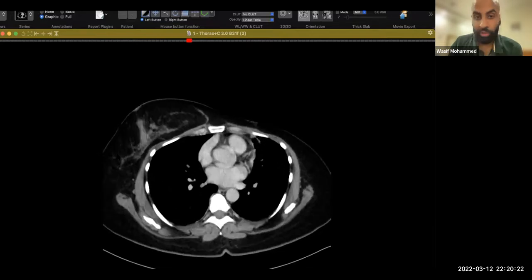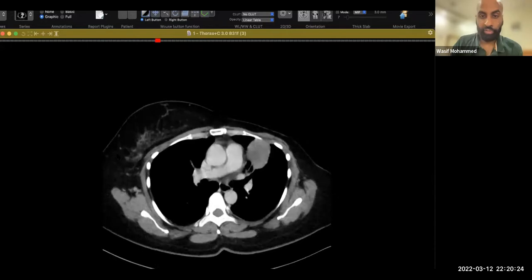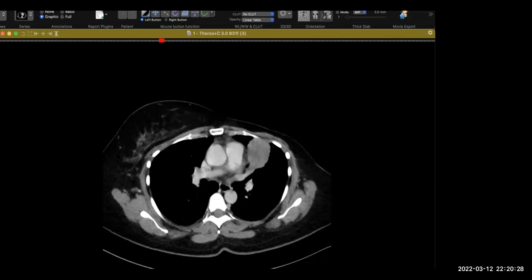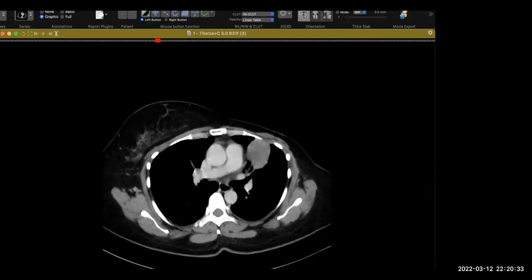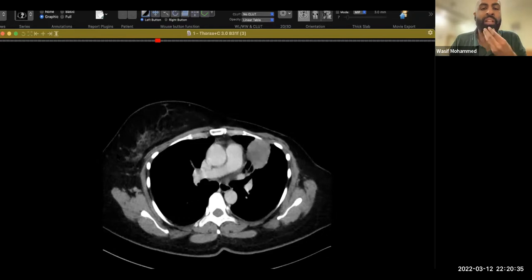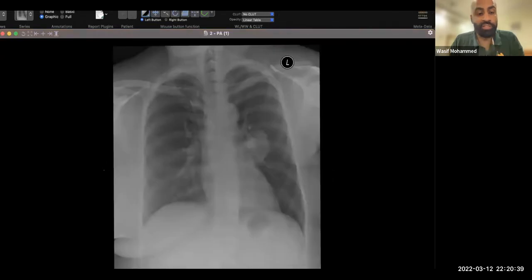And you've seen cases of past history of breast cancer develop lung cancers? Not always, but that's why I just put it low down on the list. Unless the examiner is pushing you for a differential, I wouldn't bring that up. This is a clear-cut case of metastasis. I would just look at the examiner at this point. Probably the film will change, rather than say something controversial and get myself into hot waters.